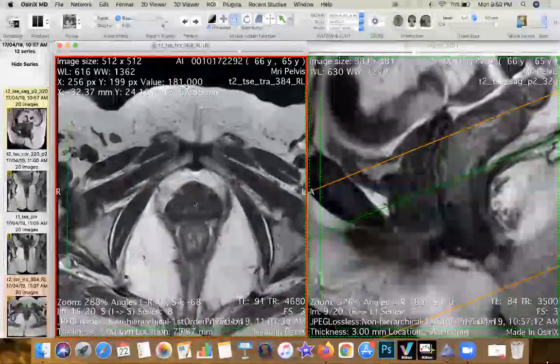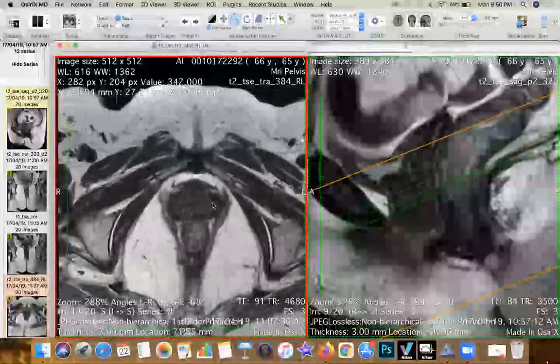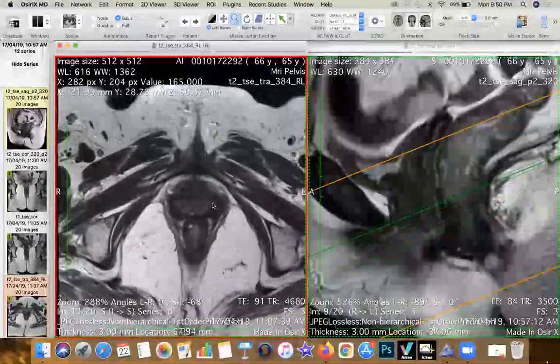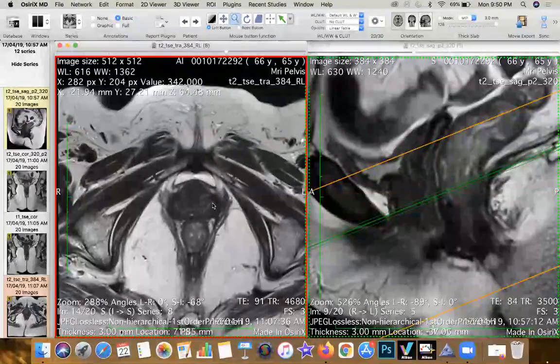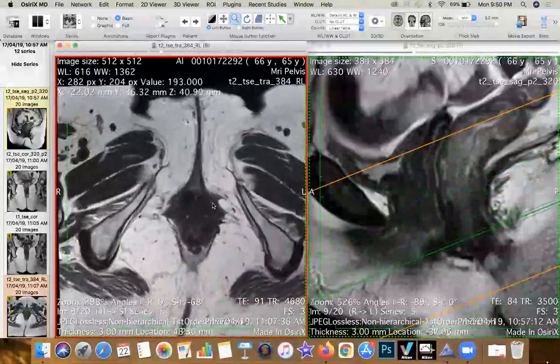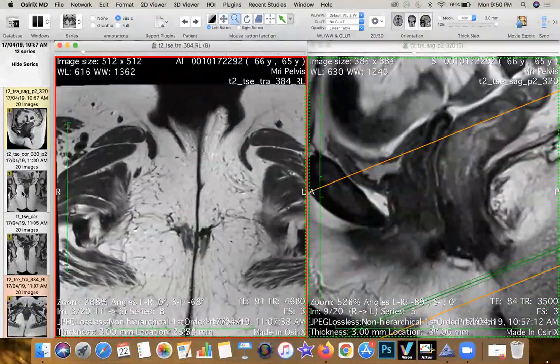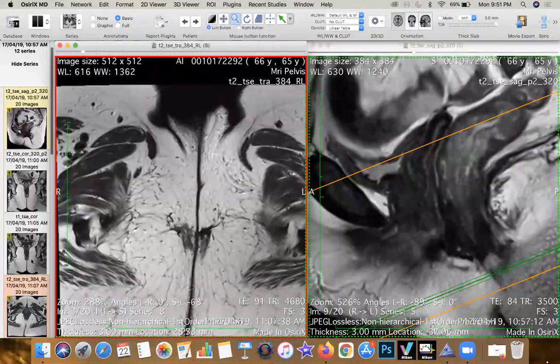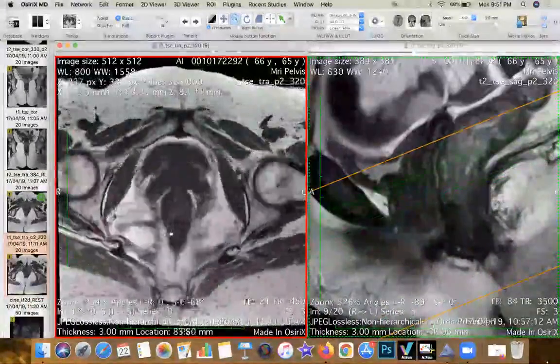Now, please remember, all these folds and all these muscle layers are very, very critical, and you need to identify each of these structures before you give a normal report when you're looking at pelvic floor structures. So what I've done, over the last 50-odd minutes, is show you all the key structures which are located in the central compartment of the pelvis and the perineum. Over the next 10 or 15 minutes, I'm going to reiterate certain important points about the pelvic side wall, which is equally an important structure when I'm studying this entire part of the pelvic floor anatomy.